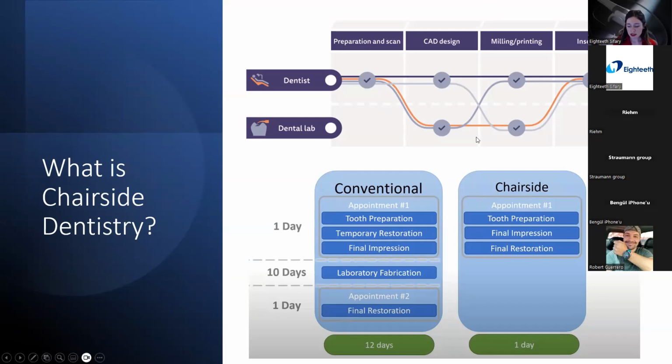I'm going to explain: if the doctor has an intraoral scanner, designing software, and a printing or milling machine, they can also complete the whole workflow. But mostly doctors don't have much time, so they don't prefer that. They prefer going with a conventional but digitalized workflow, which I will be demonstrating to you today.